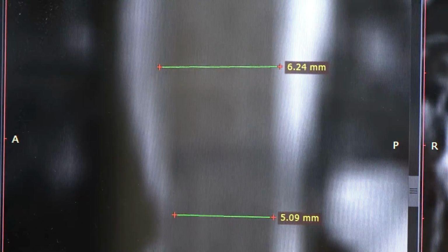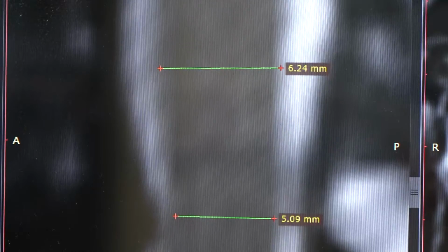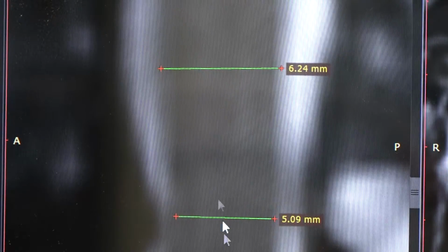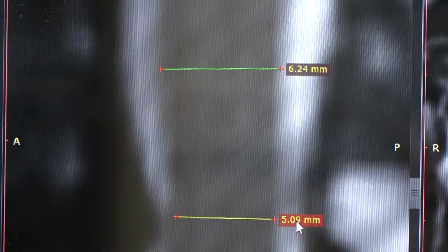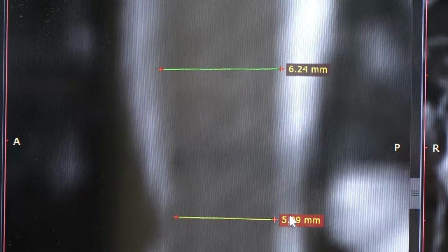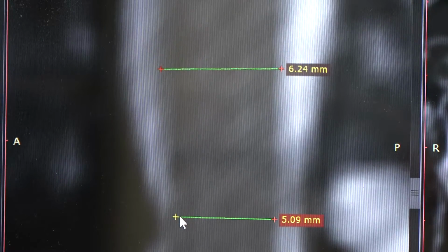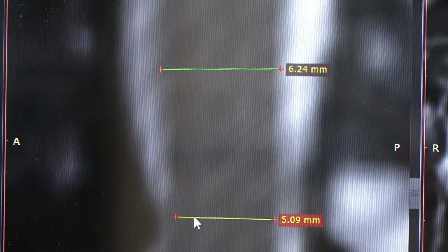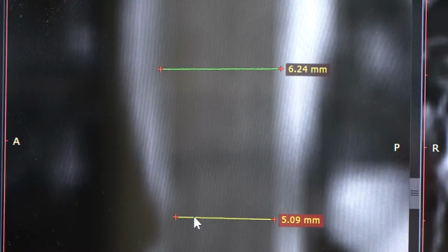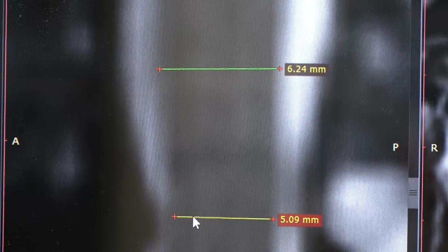So imagine what happens to the nerve fibers that course through the spinal cord, and of course you know that there's about 1 million nerve fibers running up and down. So this degree of difference implies that the same number of fibers has to go through a narrower space, meaning they're crowded, they're crunched, and there's pressure on the nerves, there's pressure on the blood vessels, and it leads to certain physiological abnormalities that are expressed then as pain and as neurological weakness or numbness.